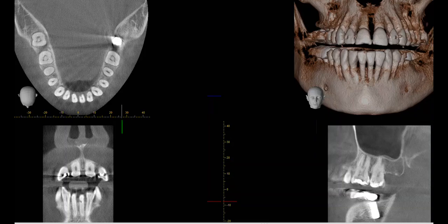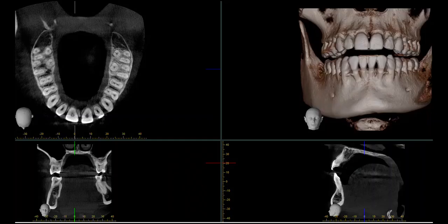The good news is if you don't have a CT scan, the majority of patients have similar anatomy. So if you follow this protocol, you should be good. Let's look at a CT scan to demonstrate this in both the maxilla and mandible. Later on in this video, I will show you on an actual patient these injection sites and how to give these injections with minimal discomfort.